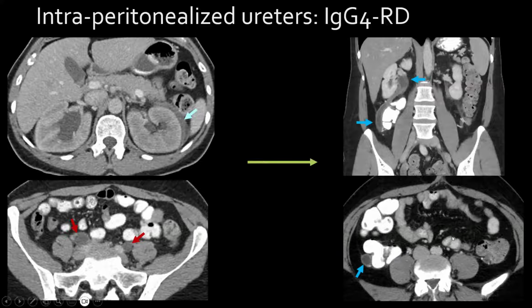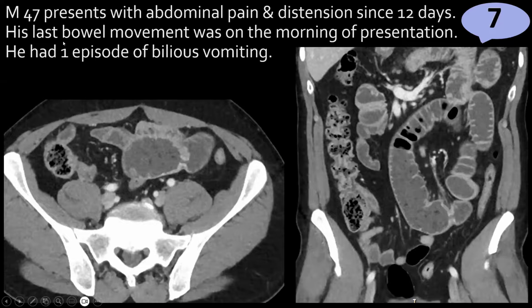Can I show one more? Yeah. Okay. I'll have to stop share for. So this is a 47-year-old male who comes with pain in abdomen. And sorry, I just have stills here. See a small bowel stricture with upstream dilation.